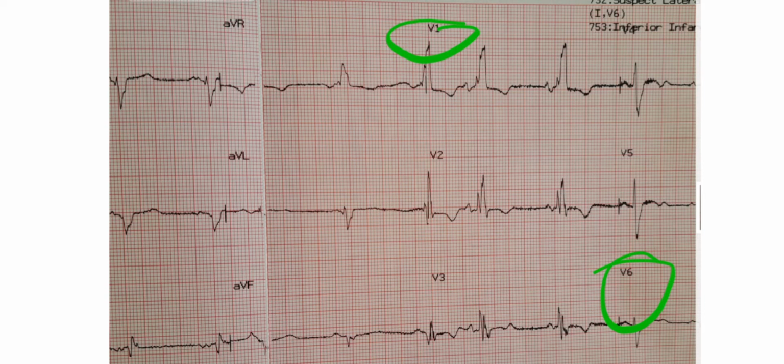There is a name that I gave you guys in that video that I uploaded during the day, a way of trying to remember a right bundle branch block or a left bundle branch block. In this case, we've got a right bundle branch block, but I'm going to prove why I'm saying it's a right bundle branch block.